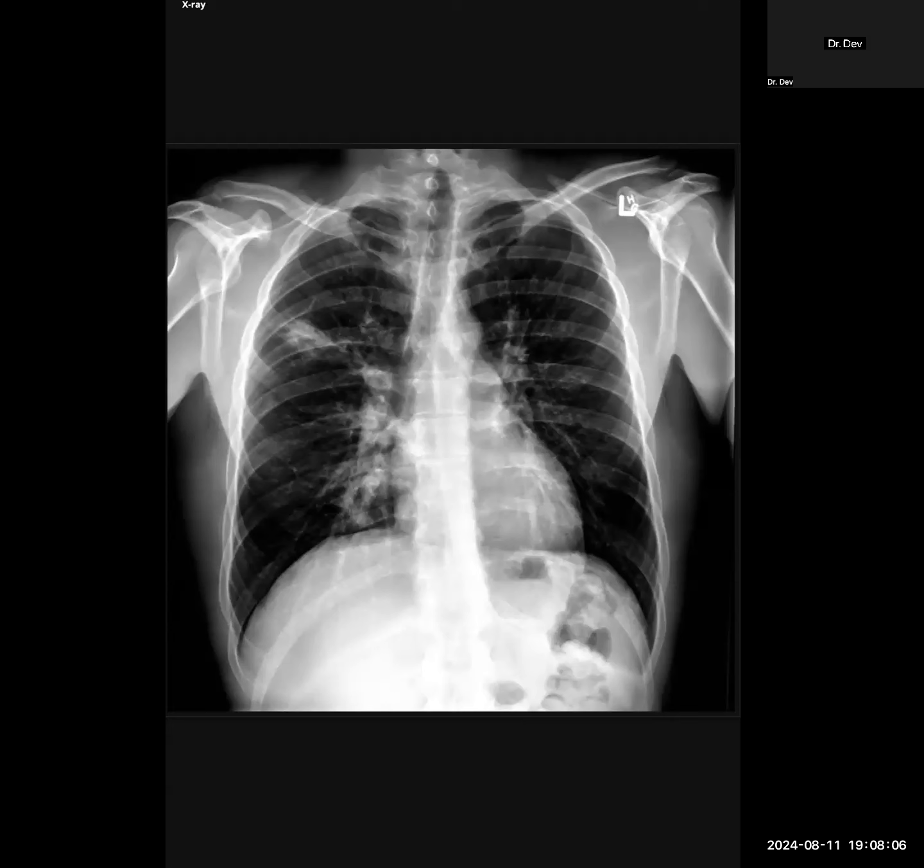So this is a teenager who's come with cough. What do you think? Provided is a frontal projection radiograph of a teenager presenting with cough. I can see a round opacity, possibly consolidation, involving the right mid zone. I can also appreciate prominence of the right hilar structures. The vascular structures are also prominent. I would correlate with any previous images if available.